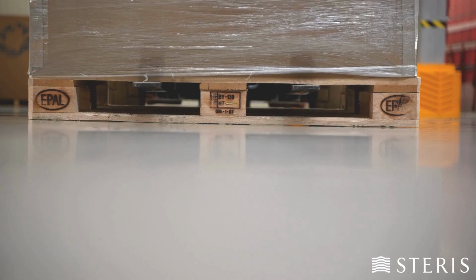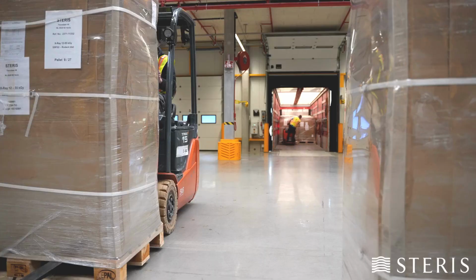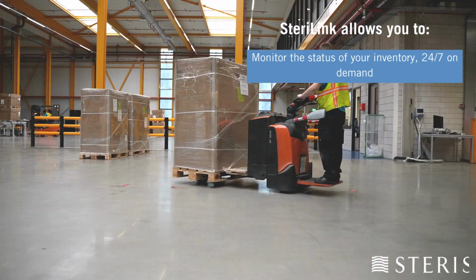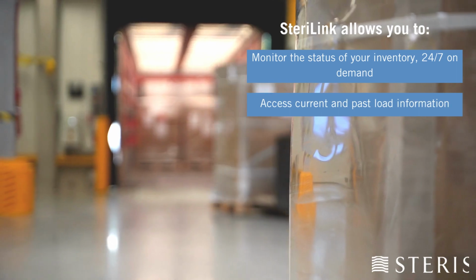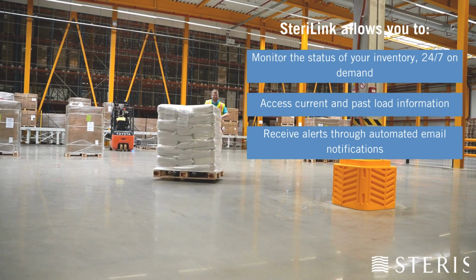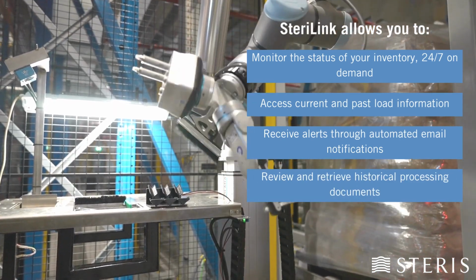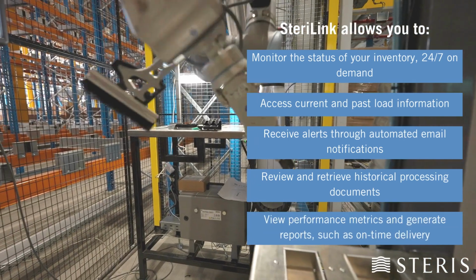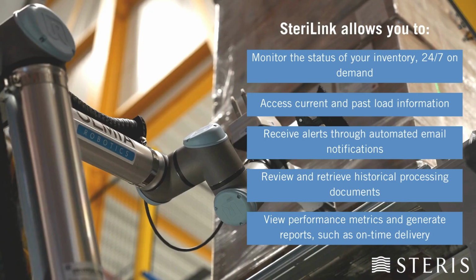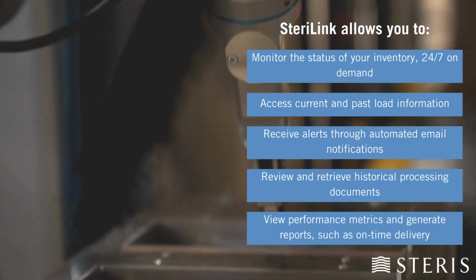SteriLink is designed to shorten time between manufacturing and distribution by allowing you to monitor the status of your inventory 24/7 on demand, access current and past load information, receive alerts through automated email notifications, review and retrieve historical processing documents, view performance metrics and generate reports such as on-time delivery. In short, you gain complete real-time visibility into our facilities so you can make critical supply chain decisions faster.